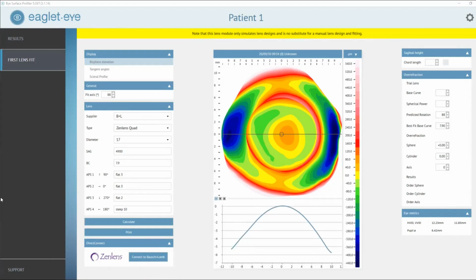So I hope you enjoyed this quick demonstration of the ESP software. And of course, there's so much more to learn.